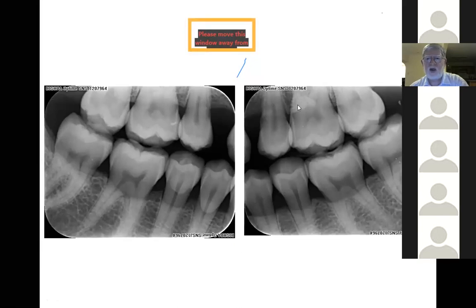Okay, so again, everyone's picked up that these are buccal cervical abrasion lesion restorations. You can see there's been quite a lot of bone loss in this patient, almost down to the bifurcation on the one side of the tooth.